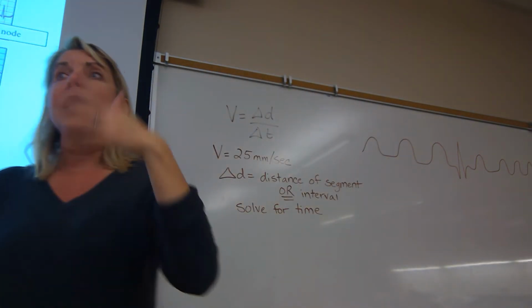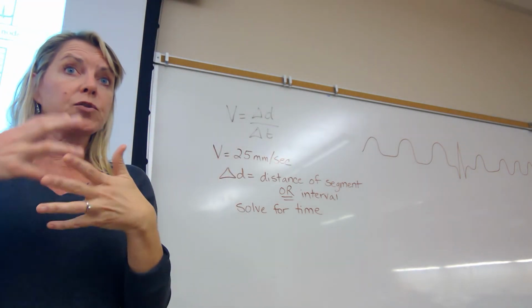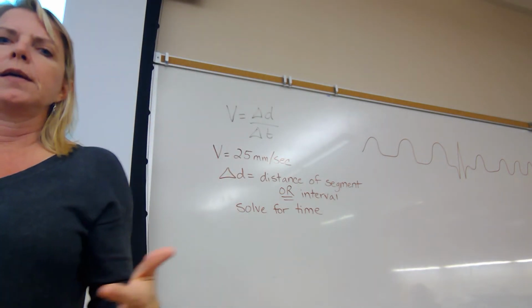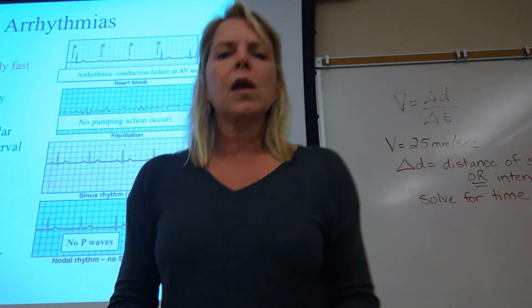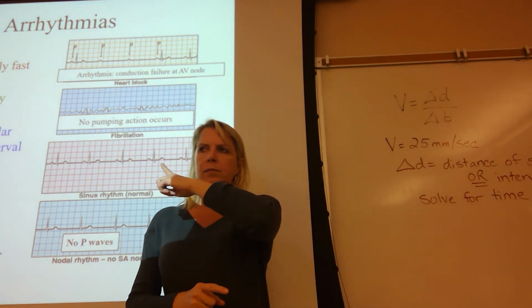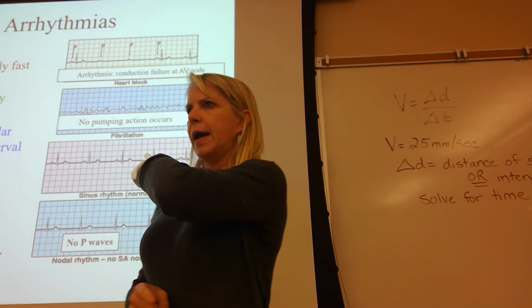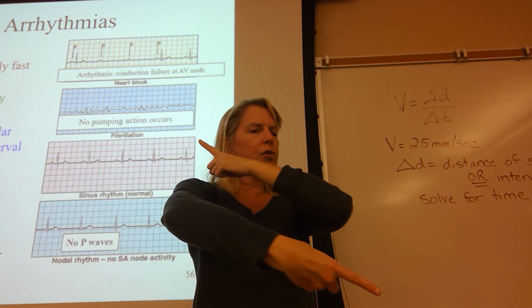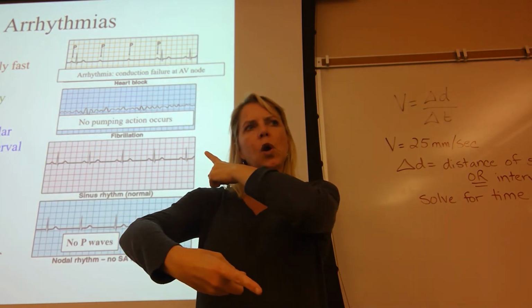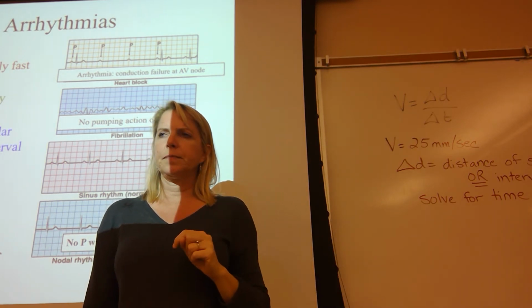But I also said, I want you to see it because it's happening. It is happening. The atria are repolarizing. So I'd like to revisit that now. If that atrial repolarization was a vector I asked you to know, and it's pointing up to the right, and we recognize that lead 2 points down to the left, what would that look like in an EKG picture?